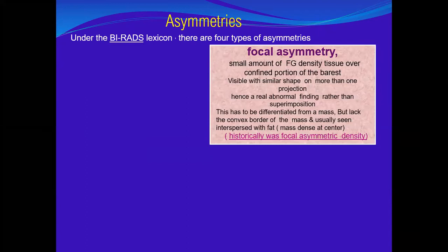But sometimes, rarely, it can represent superimposition.